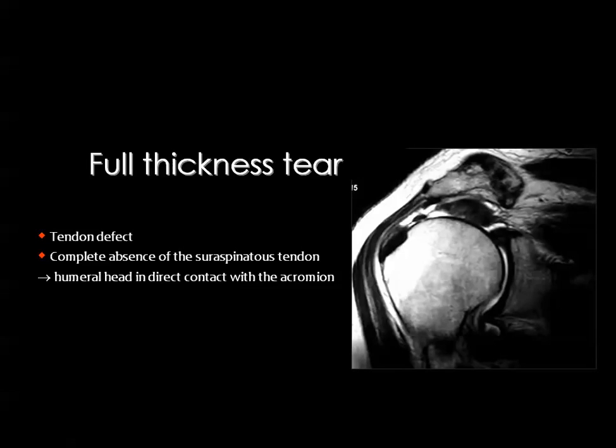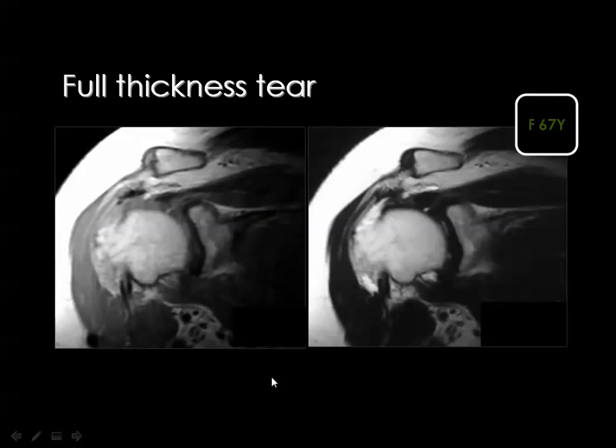I would like to mention here that the myotendinous junction, which is the junction between the muscle and tendon, usually contains fat, and this area is not an area to be evaluated for tears. The tears are evaluated in the tendon itself, not in the myotendinous junction or in the muscle itself, but you evaluate supraspinatus tendon tears in the tendon itself.